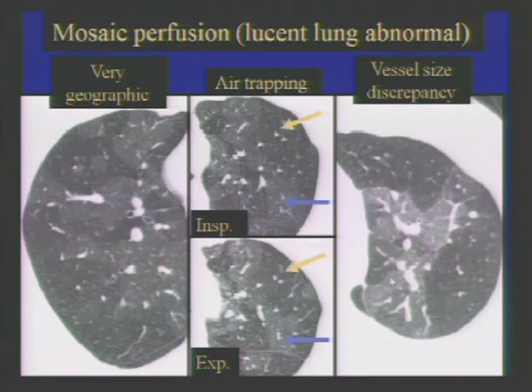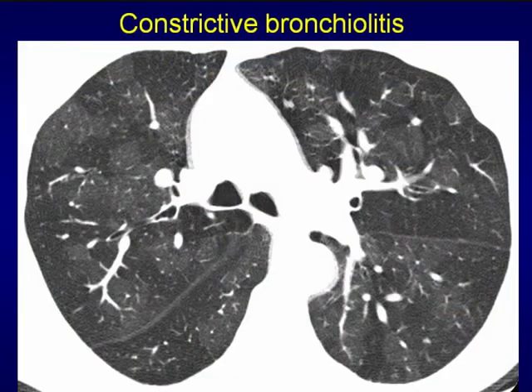And this is actually a patient with chronic PE. Sorry, that's in there for an airways talk, but you can notice, and that's particularly prevalent with vascular causes, the vessel size difference. Notice the tiny little vessels in the lucent lung and the larger vessels in the more opaque lung.